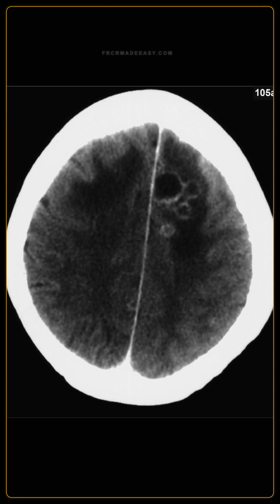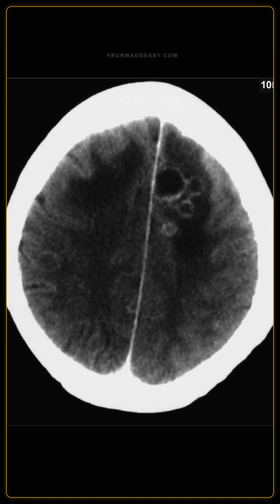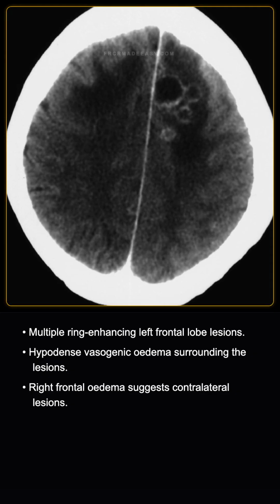A 68-year-old male presented with pyrexia and fits. I am showing you a contrast-enhanced brain CT scan. Describe the findings. Okay, looking at the images.